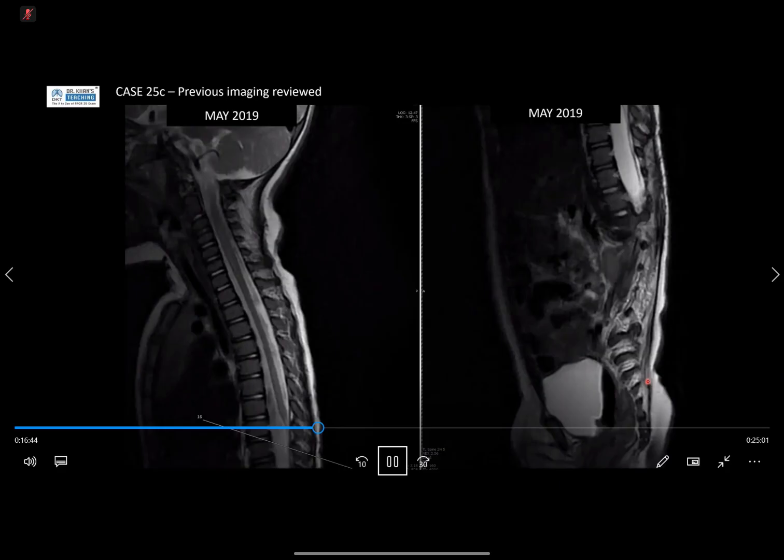Do you still see, on the right hand side of the lumbar spine or lower spine, that big lesion anymore? The patient had aggressive treatment. I can't remember what they give to treat neuroblastomas, but essentially they gave him the all clear. There is a residual small lesion seen in the mid-lumbar region. Yeah, possibly this is what you're looking at. Okay.